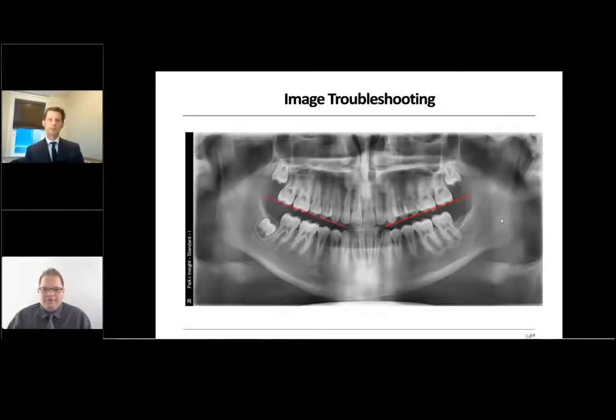Right. So this one, again, the occlusion angle is just a little bit too much there. And once the chin and head are too far down, the more tilted it is, the more you're going to start jumbling the teeth together, and it's going to throw the anteriors out of position again. And there's a lot of overlap because of that. Right. Yep. And then right, that canine line is probably off there. The mandible there too, yeah. So because they're tipped too far down, maybe head lunged out.